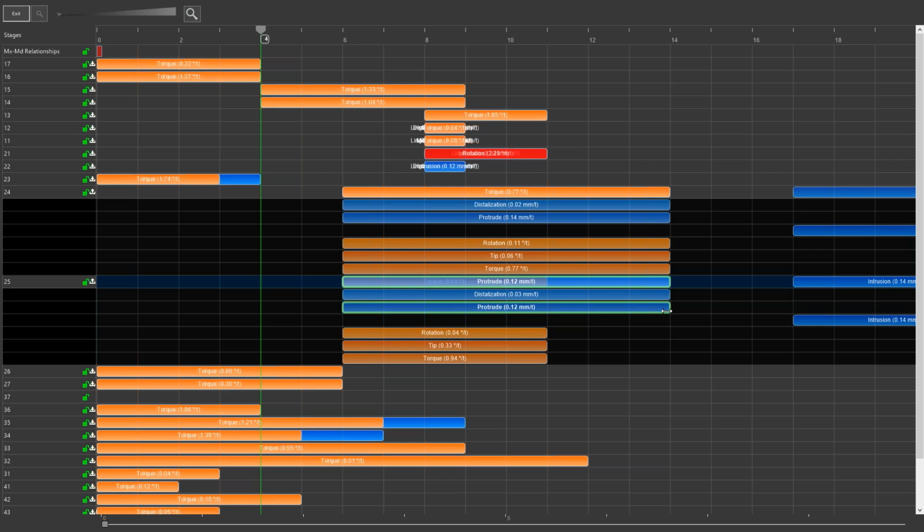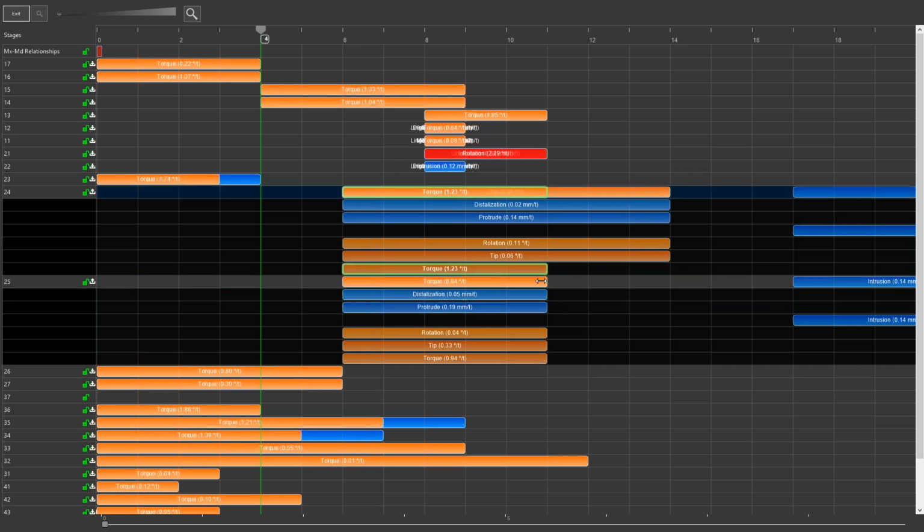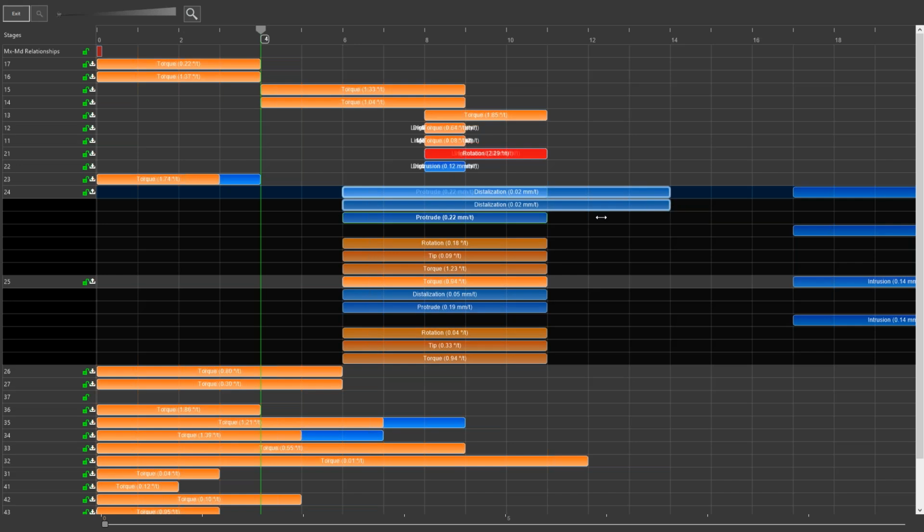So for example, here I'm going to allow, actually I can make them smaller, sorry. And because I'm not exceeding the actual threshold for the movements, I can go and do my thing.